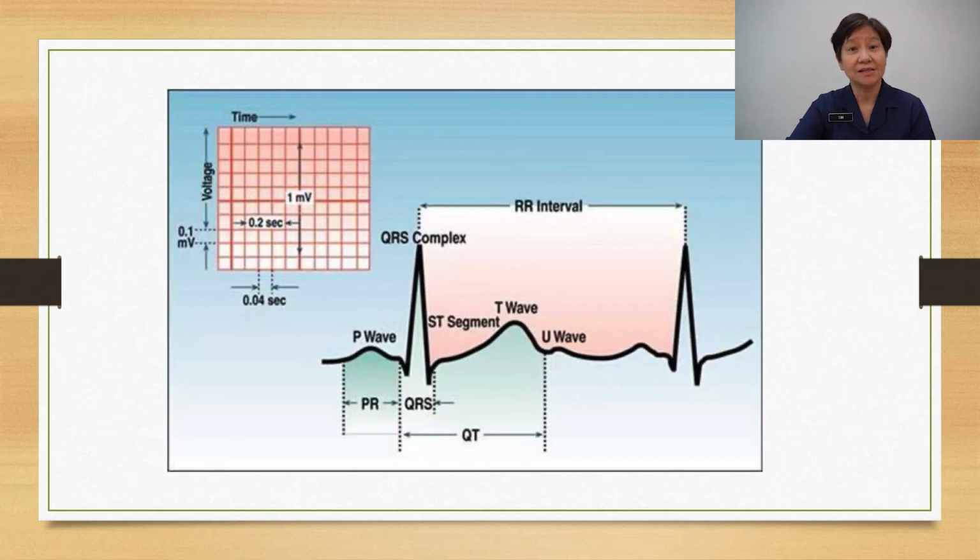Today, my task is to help you all to recognize ECG rhythm. First of all, we need to know what is ECG rhythm. You need to know about the graph.